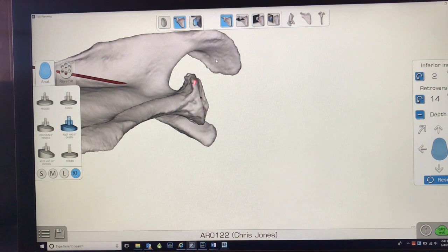Again, you can see here's the face, or the flat part of the socket, the glenoid. So this is your scapula. This portion has eroded right here. It really should be more this way. This measures about 20 degrees of retroversion, and normal is only 4 degrees.